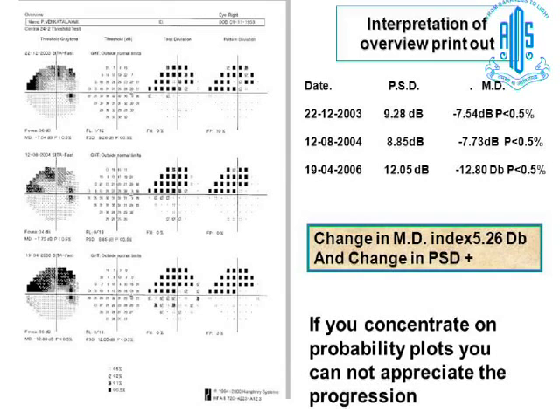Which I missed. There is a change in mean deviation occurring, -7 to -12. -7 to -12 in a localized scotoma, that concept I didn't have in 2003 and 2004. A change in mean deviation, even a small one, in a localized scotoma is huge. A good retinal sensitivity almost became absolute scotoma. And if you see the grayscale, it is appearing.